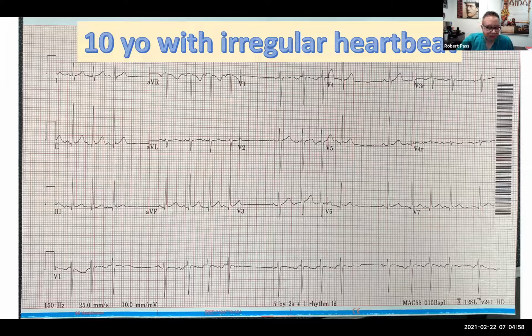Right, so this is sinus rhythm with ectopic atrial rhythm. So you sort of have a sinus beat and then 2 ectopic atrial beats. And then there's a pause, presumably because the sinus node has been suppressed transiently by this ectopic focus.